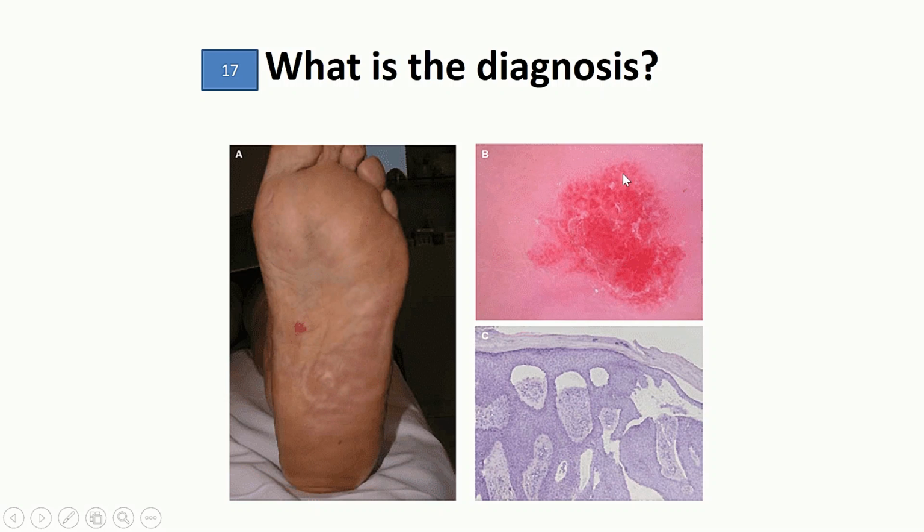These polymorphous vascular structures may be linear vascular, may be dotted vascular, so in question may resemble melanoma. But we should keep in mind that these findings of clinical image, histopathology image, and dermoscopy image, all of them are suggestive of poroma.